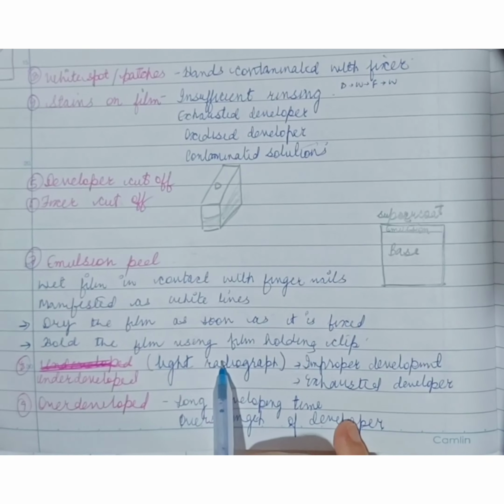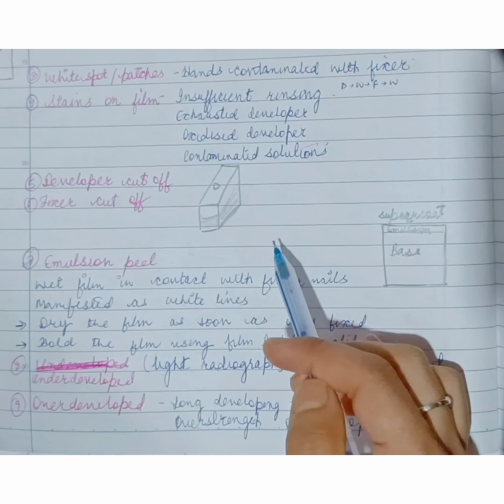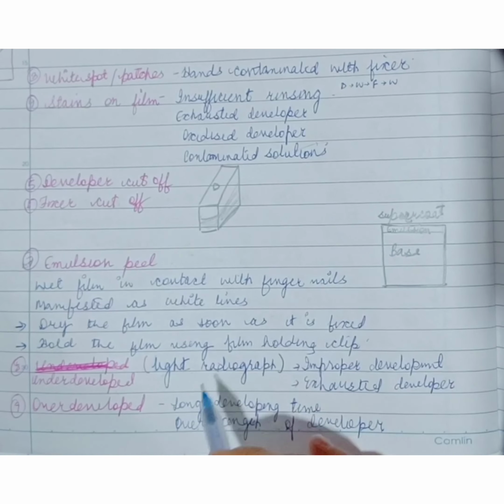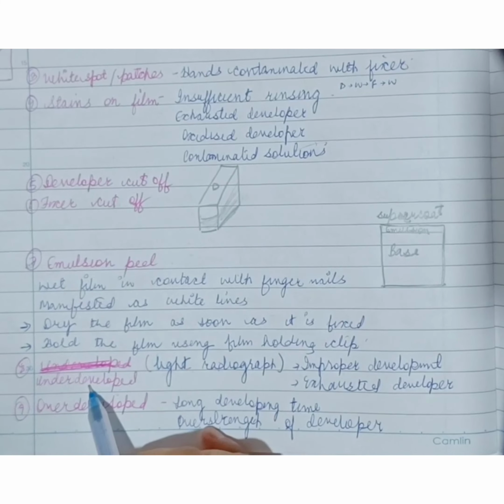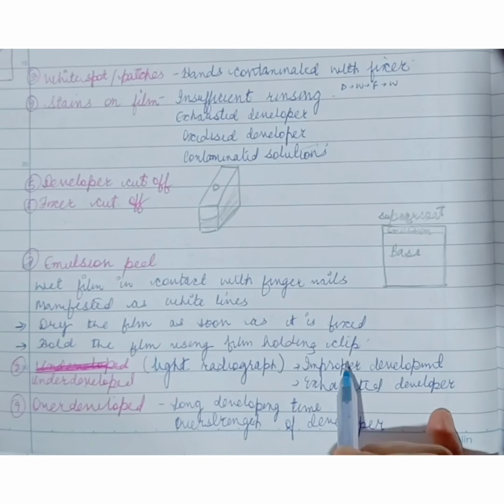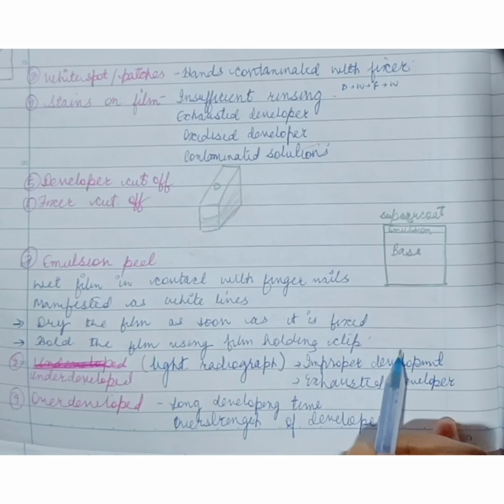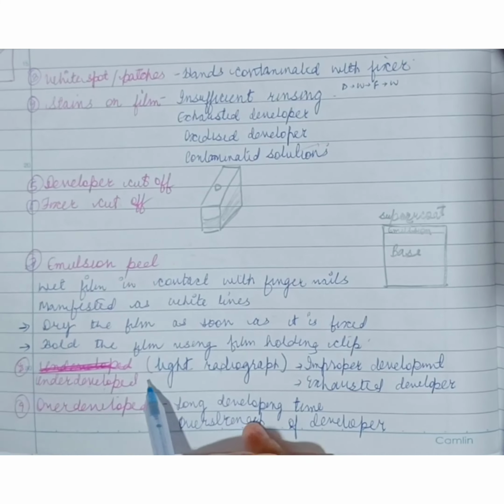So, what are the causes for a light radiograph? It can be either underexposed film, that is too low mA and kVp, exposure time, increased source film distance, or incorrect film screen combination. Or another cause for light radiograph is an underdeveloped film. So, underdeveloped film is caused because of improper development, because of less time in the developer solution, because of the exhausted developer, because of less temperature of the developing solution. So all these cause a light radiograph or underdeveloped film.